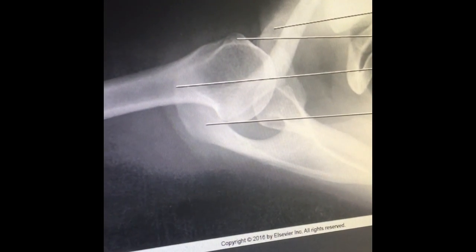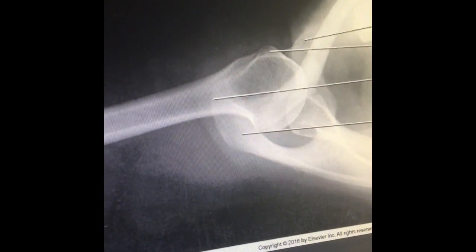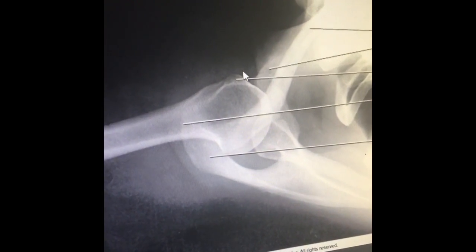Moving along, last but not least, the last image: superior inferior axial projection of the shoulder joint. Evaluation criteria for this image is just to have proper collimation. Scapulohumeral joint visible. Coracoid process projected above the clavicle. Lesser tubercle in profile. AC joint through the humeral head.